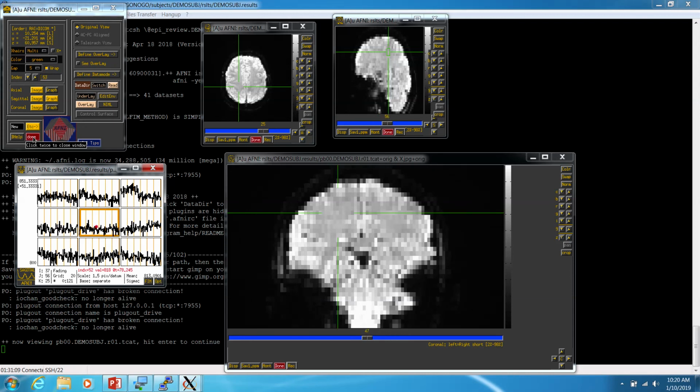or not? Because usually, if you think of raw data, you see it a little more wiggly. Yeah, this is the raw data. Very cool. Wow.